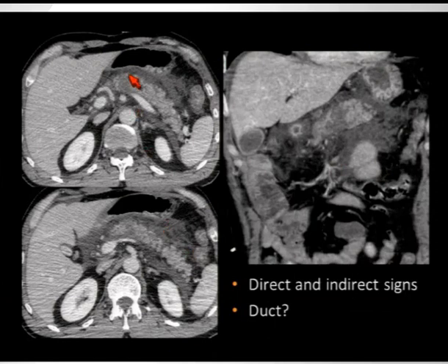Another patient, shortly after admission to the hospital, already there we see a contusion/laceration, full thickness of the gland. Very likely that it does involve the duct, especially because just 1 or 2 hours after the injury already there's abundant fluid, very likely coming from the main pancreatic duct. But before taking the patient to the OR, there was no other indication for laparotomy.